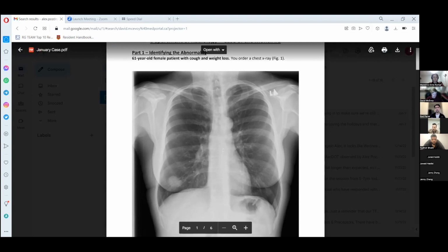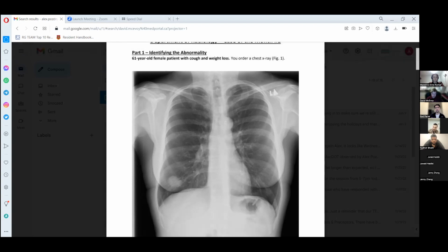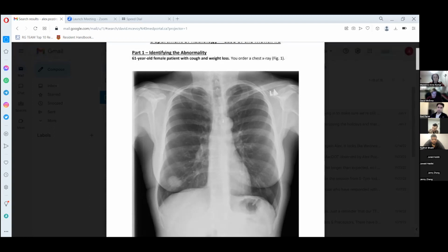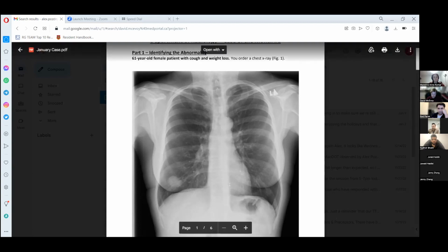We have the aorta, which goes kind of here, if you see my pointer, and then it goes down there. So this is the ascending, and here we have the aortic arch. Here you see this circle. That's usually the aortic knob, where the aortic arch involutes and becomes the descending aorta.